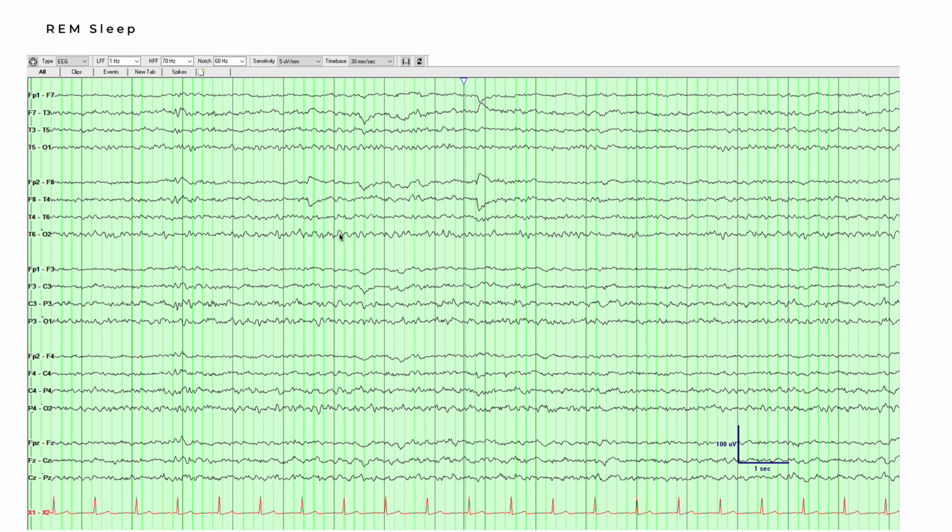And the backgrounds you see can look like wakefulness with some mix of theta and alpha frequencies and is posteriorly predominant. But you can often tell that it's not wakefulness just based on the progression of how you're getting here. You're going from sleep, they don't wake up, you start to see these eye movements, so that will help you avoid confusing this background as something that's abnormal.